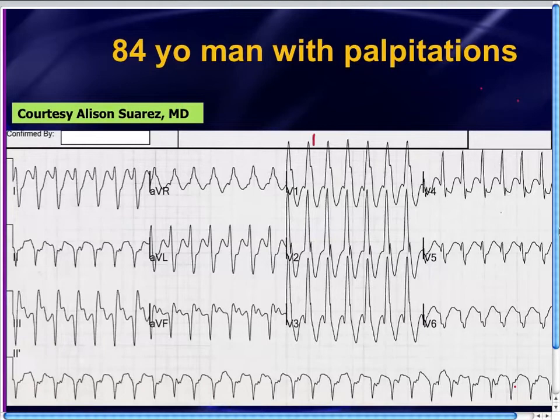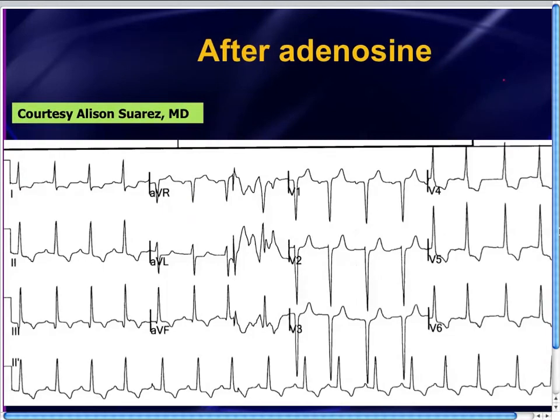The patient has a taller left rabbit ear. The patient has axis in no man's land, extreme right axis deviation. There's also a much deeper S wave in V6. There's 3 really good reasons that this has to be VTAC. Well, cardiology came, saw the patient, said, yes, it's clearly VTAC. This is one of those examples of adenosine sensitive VTAC.